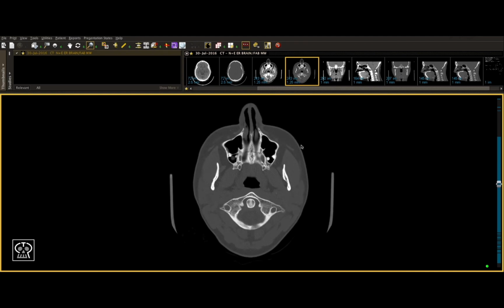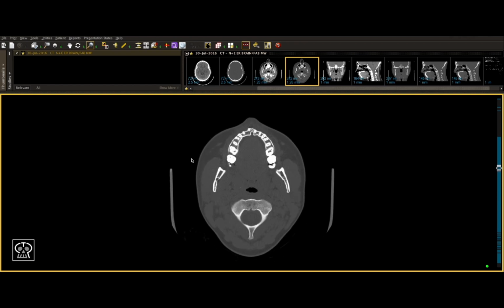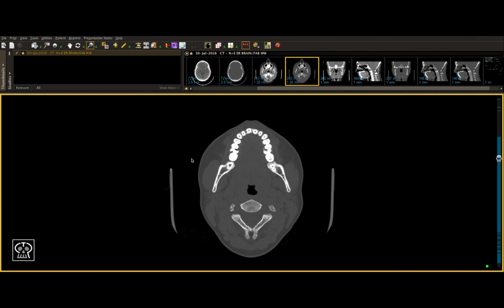The same principles that apply to the mandible will apply to almost every other bone we analyze in the face. You'll always be looking at the cortices for a smooth outline, checking for any breaks, but always correlating with your known anatomy. The first part of analyzing the maxilla is examining the alveolar processes themselves.